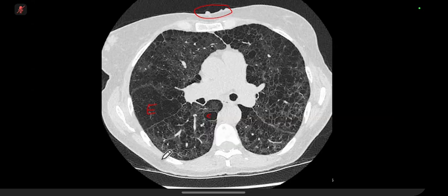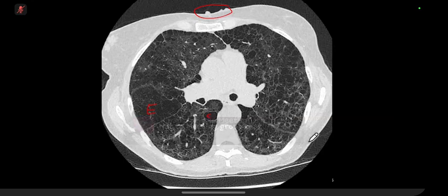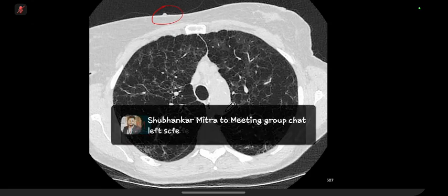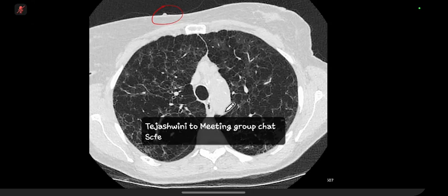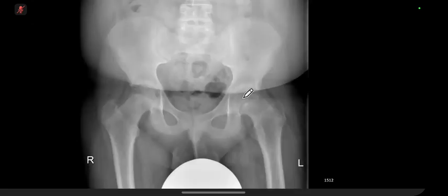Obese 15-year-old boy with a limp. What do you think's going on here? Yeah, SUFE. So this is slipped upper femoral epiphysis. So the gap between the epiphysis and metaphysis has increased. It's a kind of optical illusion. The other thing is that Klein's line no longer intersects the epiphysis, okay, because it's been a slip this way and backwards.